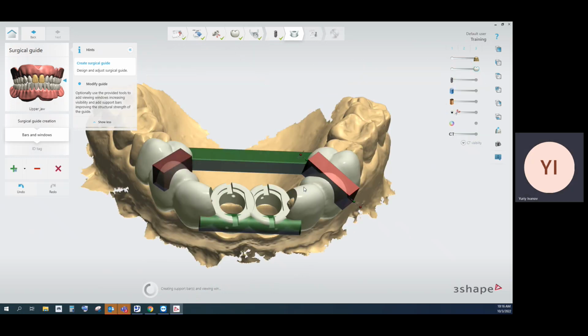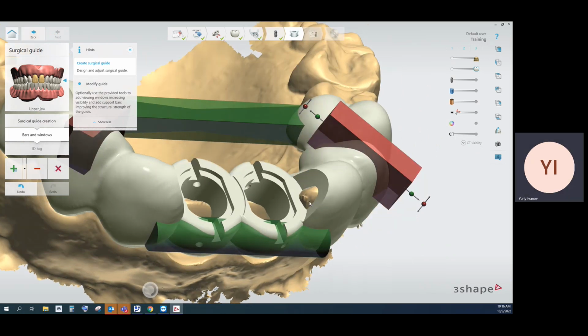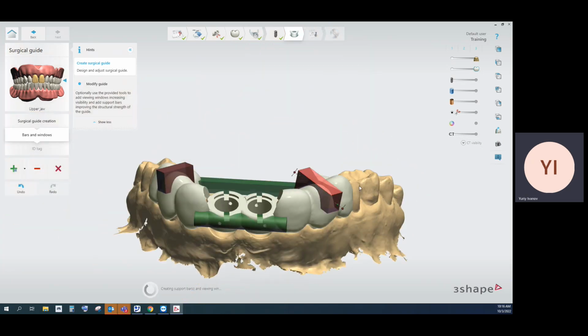By the way, here in this case, you could see we have this lateral tooth sticking out a bit, so it could be also helpful for us to figure out, are we in the proper position with our guide or not.